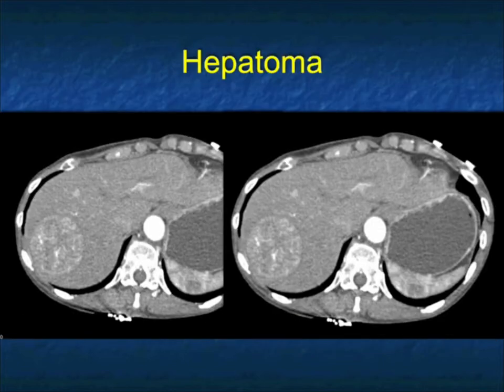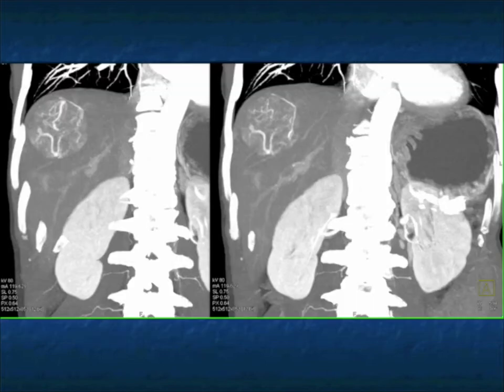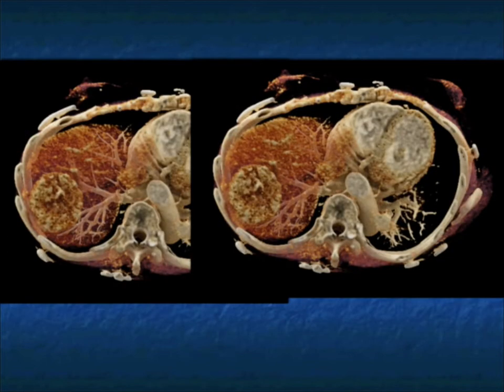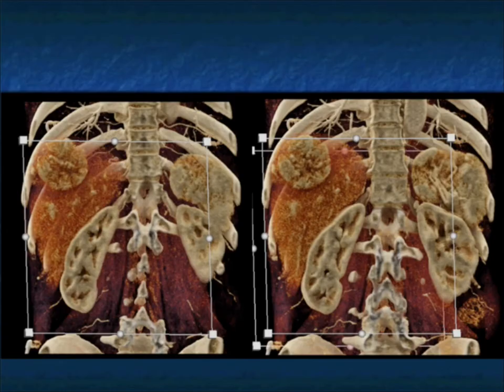I mentioned before about pseudocapsules. Here's a good example. That's a classic thing for hepatoma. Look at the neovascularity. You can have well-defined lesions that I'll show you with hepatic adenomas or FNH, but that impressive neovascularity through the lesion, and you can see the feeding hepatic artery, really make the diagnosis. And again, cinematic, looking at the textural change, really showing you the lesion nicely.